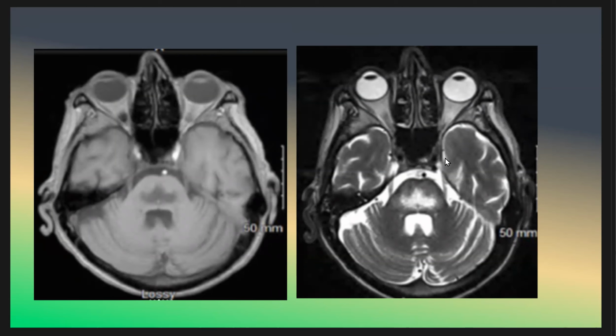What do you think this patient has? This is a 59 years old male with altered mental status and syncope. What do you think the patient has?